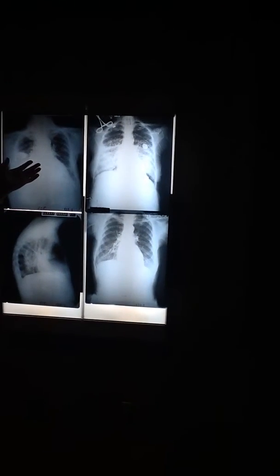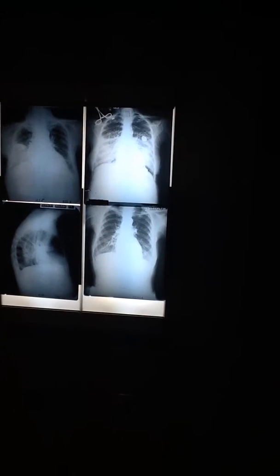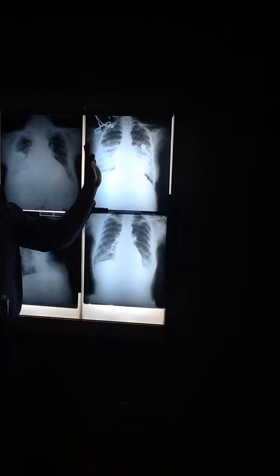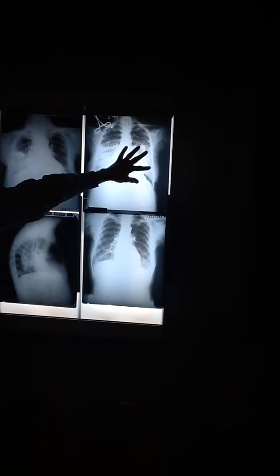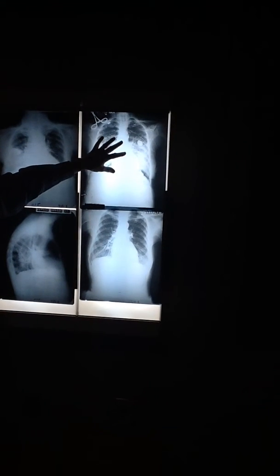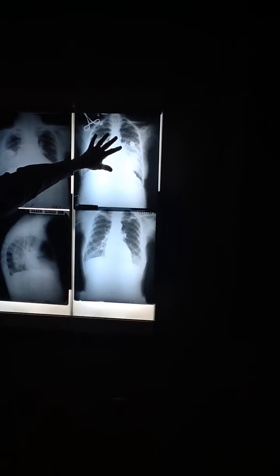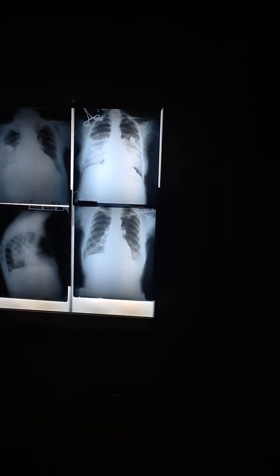This is interstitial edema. That one over there is interstitial edema. And they get the spider web in the medullary part of the lung. This one is past the spider web. This one is going into airspace edema, but this is not a full butterfly shadow yet. But it's getting there. And this may have happened just in a matter of 30, 40 minutes. That's one of the reasons they have such a hard time breathing when they have a heart attack.